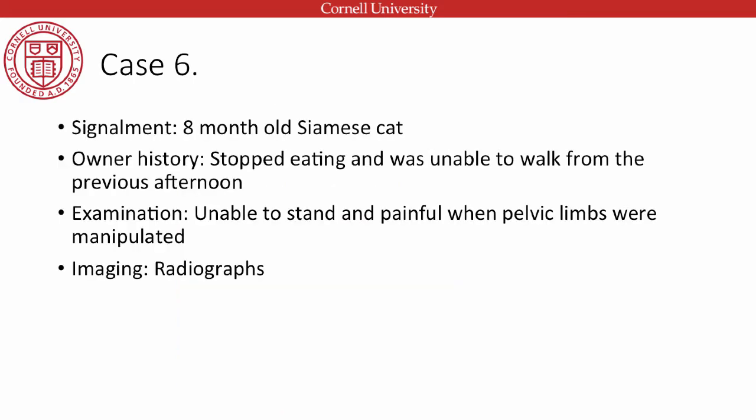Moving on to an 8-month-old Siamese cat. Owners reported that she stopped eating and was unable to walk from the previous afternoon. On examination, she's unable to stand and painful when pelvic limbs were manipulated. And so radiographs were opted to be taken.